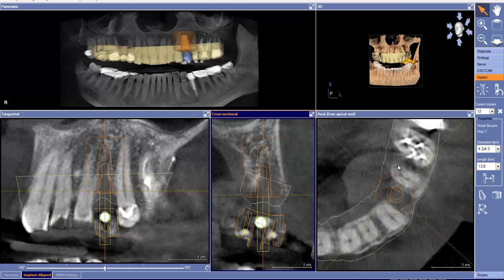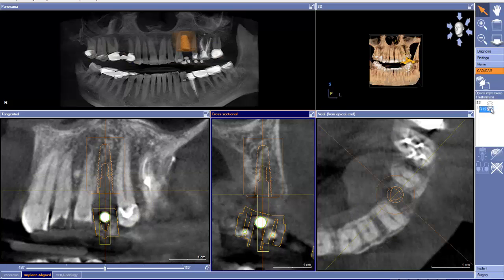Now, this case has been sent to me, and the CEREC Guide X-Ray 8 has already been registered, and it looks like the registration is very accurate. I think the bigger question in this particular case is setting the D2 value more so than the implant planning. But before we move forward, I would like to give you an idea of how I'll do this.